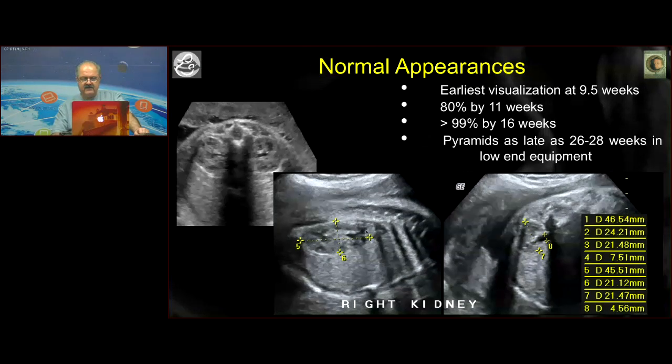We will come to measurements later, but there's a good illustration here that truly speaking, the important measurement is the anteroposterior diameter of the renal pelvis in an axial section. We put the plus points on the white portion of the actual renal pelvis wall, measure the distance between them, and mention it in the report.